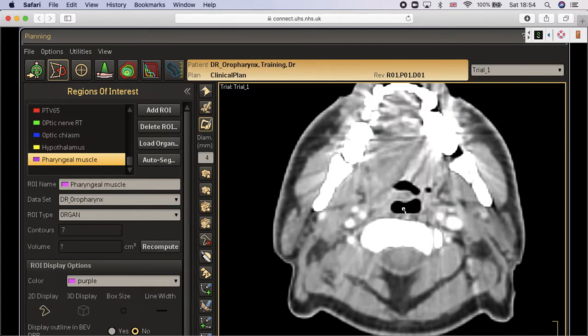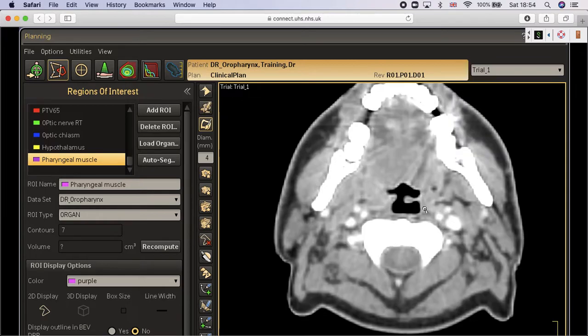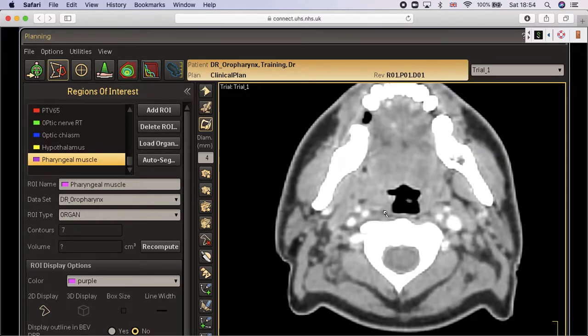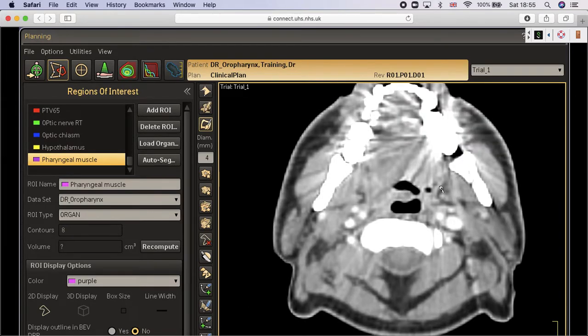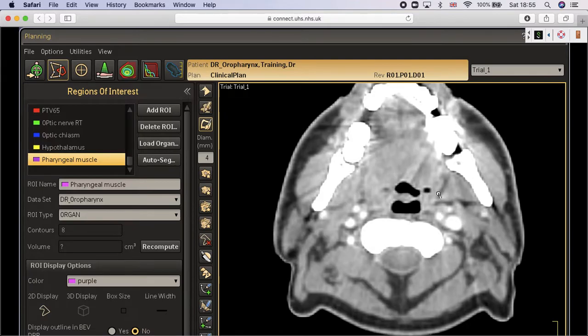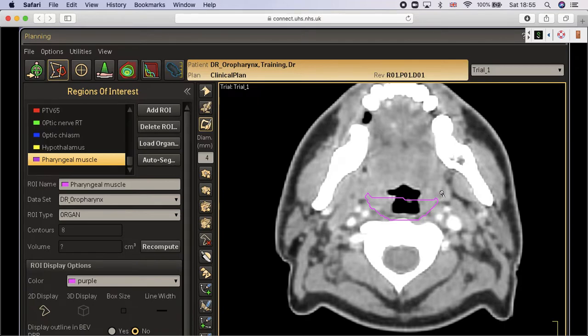Then when you go more and more down, we said that you go down the pharyngeal muscle on either side, it will start to be a plate shape. It will be something like that, because you cannot see something extending after the mandible. When the mandible starts to disappear and the joint, this raphe, this lateral pharyngeal extension will disappear, and the muscle will be just as if it's a plate shape.